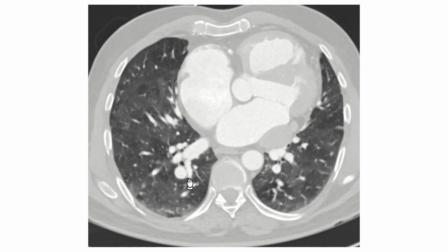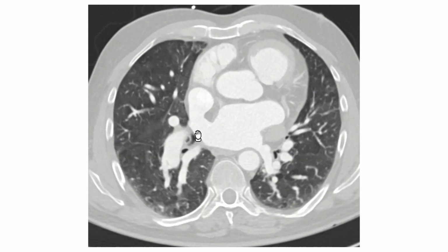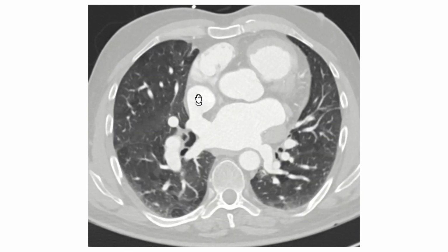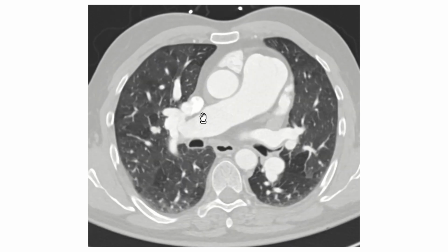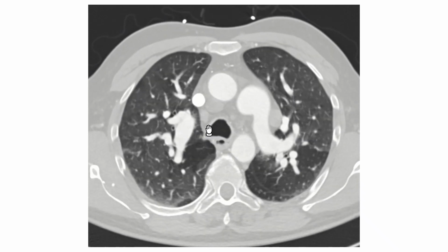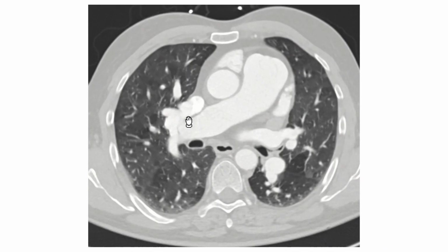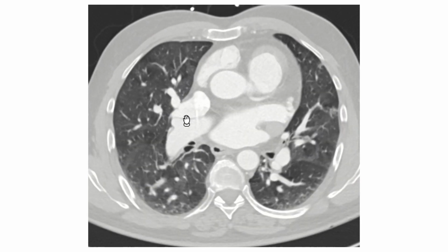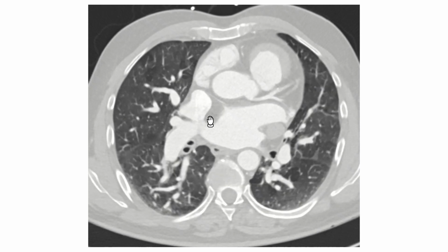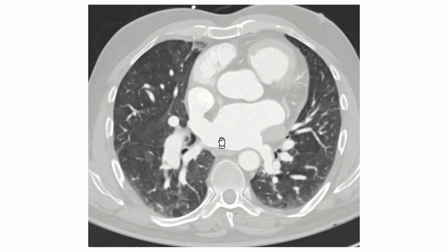If we follow the same on the right side, we could see the right lower, and there is an accessory lower draining to the left atrium. However, we could start seeing a kind of defect at that point in the right-sided superior vena cava, which should only drain to the right atrium. However, on the way down, from cranial to caudal, while it's going down to the right atrium, it's draining one of the pulmonary veins, one of the tributaries, most likely the right upper, and at the level of the right middle pulmonary vein, we could see that it is communicating with the left atrium. So it's a sinus venosus defect.